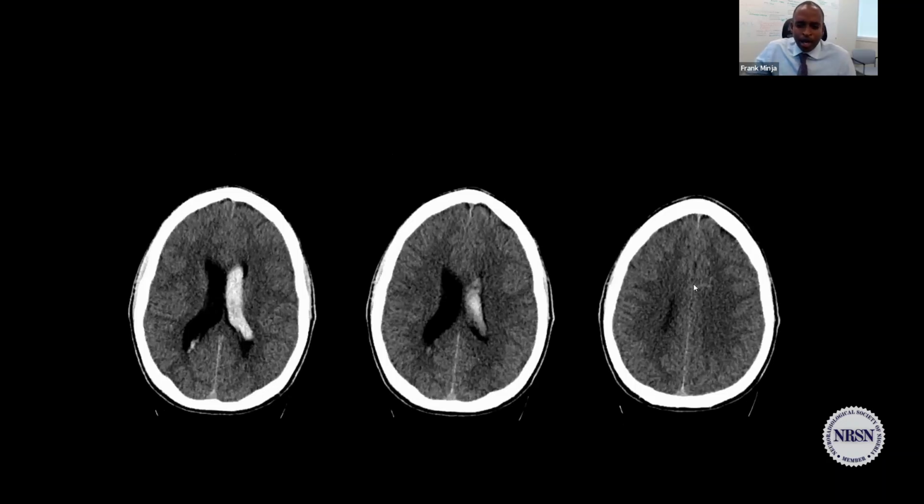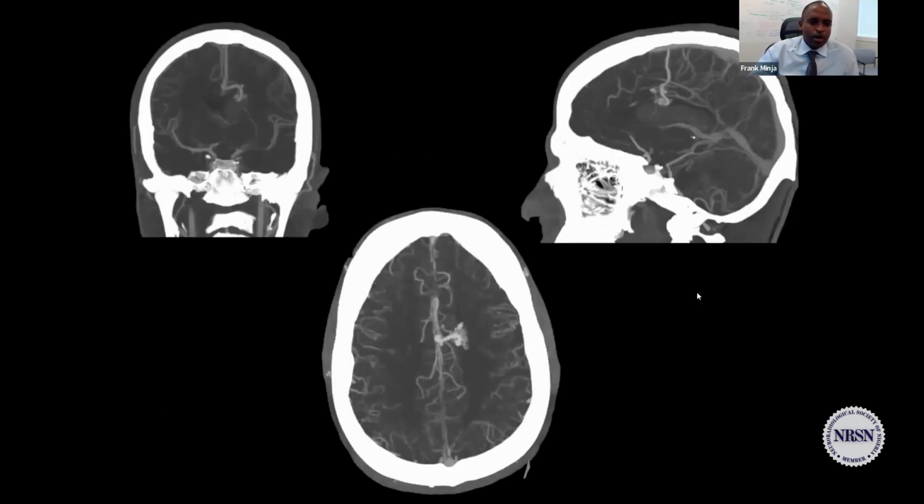So not much. I mean, you really have to squint to say, is there something here, maybe some underlying lesion? I'm not 100% sure. Okay, all right, fine. We're going to get a CTA on it, and voila, they have a prominent draining vein. We have a little nidus, right? We also have a little intranidal aneurysm, right?